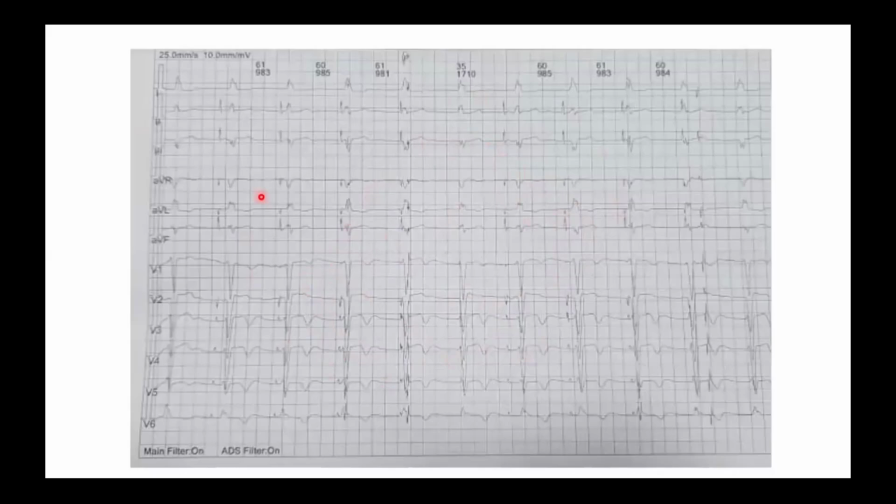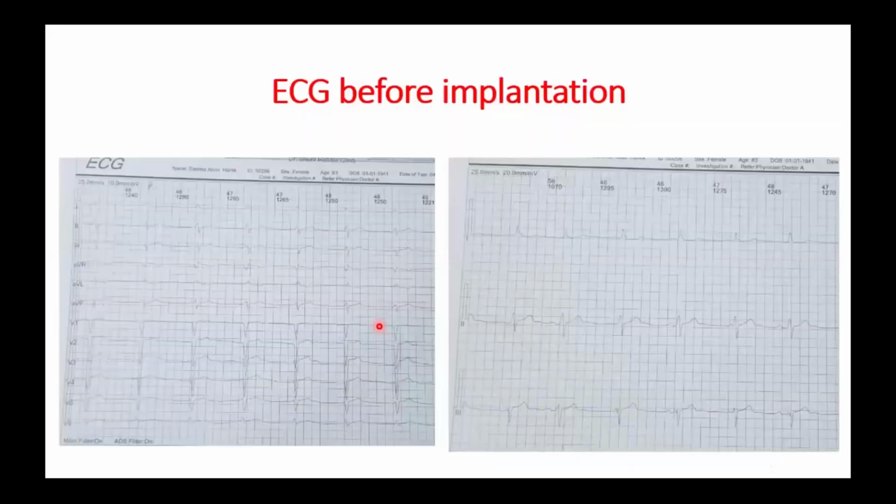Excellent. What can we appreciate in this ECG, and how do we solve this problem? Dr. Hammam, this is a very tough question. I know we could not solve this problem easily. First ECG, please.